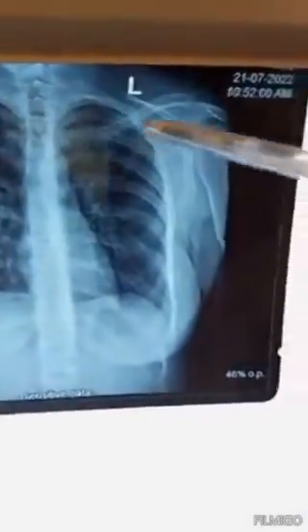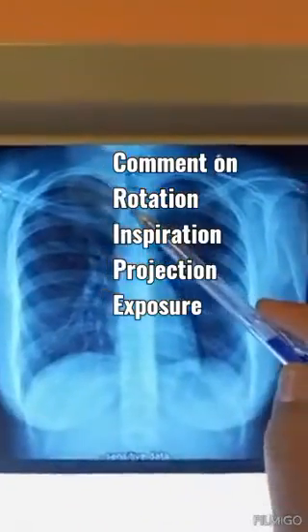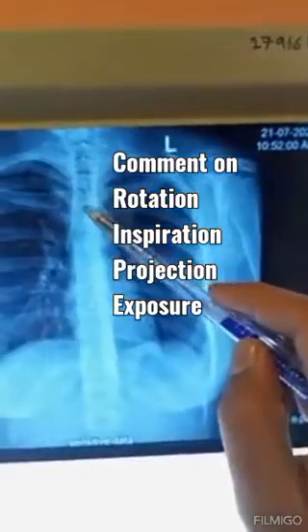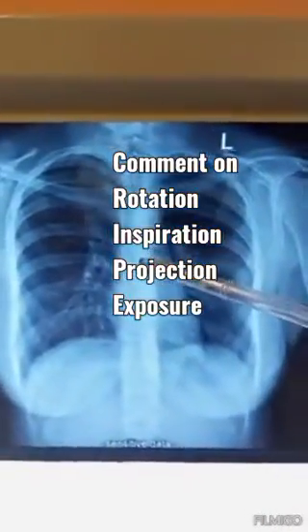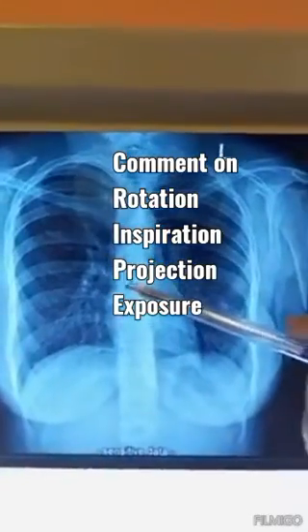So comment on the vertebra and spinous process. If you see the vertebral body in a very clear manner, like look at this vertebra and this vertebra, they are not so much clear. So if they are not so much clear, it means that it is mild exposure, right?